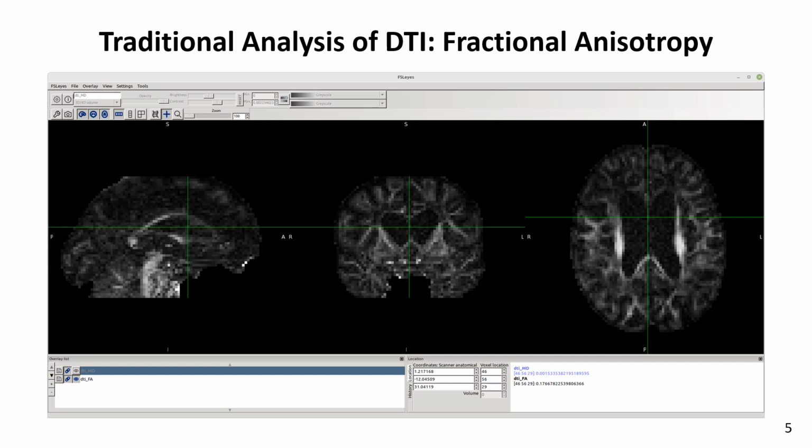Second, fractional anisotropy and mean diffusivity only correspond to 2 degrees of freedom in the diffusion tensor, while our system permits a more detailed analysis that accounts for all 6. Therefore, even though our system only requires going through the data once instead of twice, it still conveys a more comprehensive picture of the full tensor information.